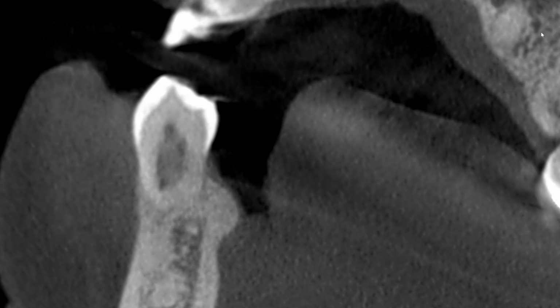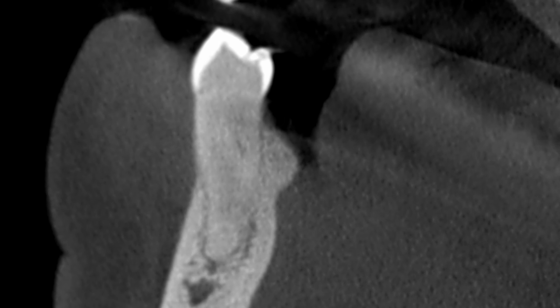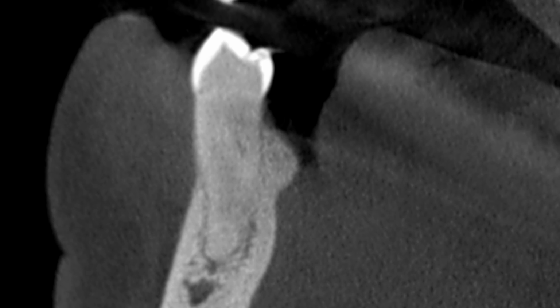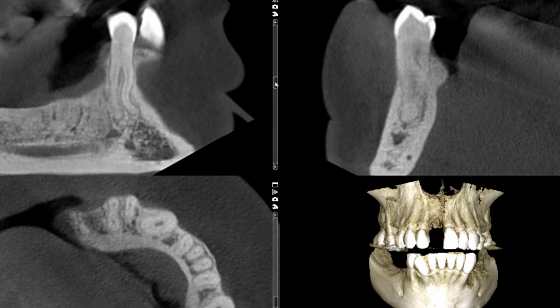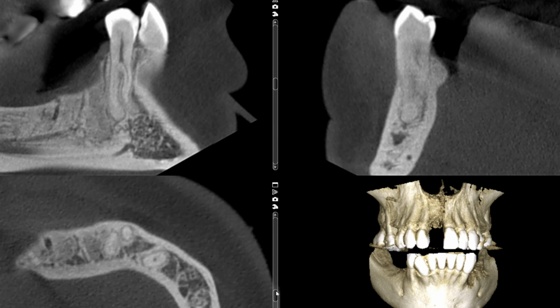And now let's take a look at this cross-sectional view. Let's see, am I going mesial? I presume so, because this looks like it's canine. So let me go to distal. Go to distally. So here we go. Must be mesial. Wait, that must be distal then. And then this is the mesial. So there's mesial and distal. It's a little hard to see because there's a curvature of the root. It's hard to capture the entire root in a single plane. So I think the most telling image is here in this view, as well as the axial view, right?